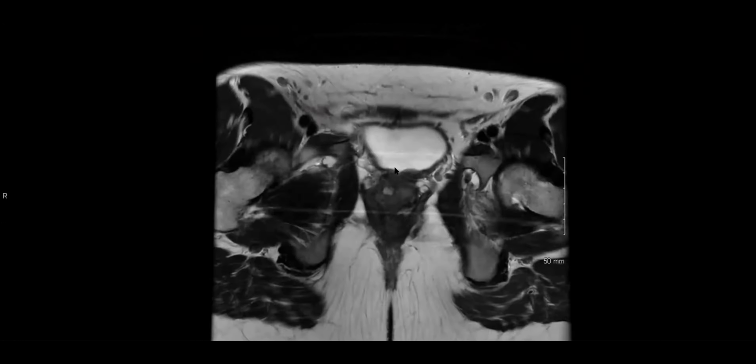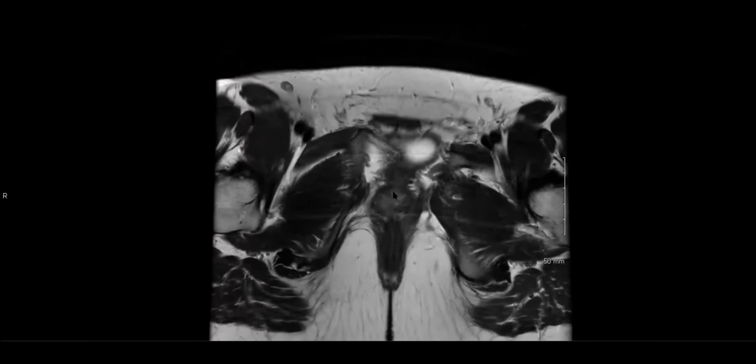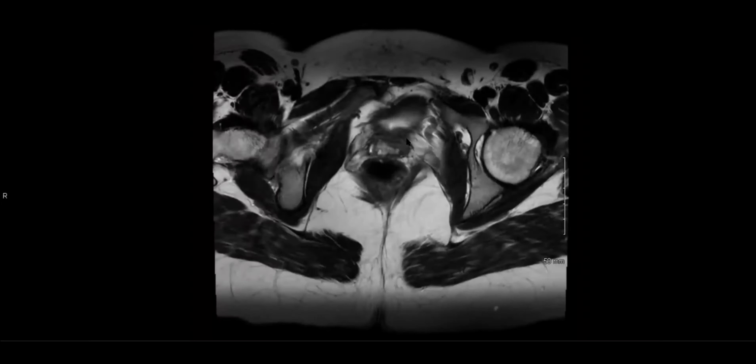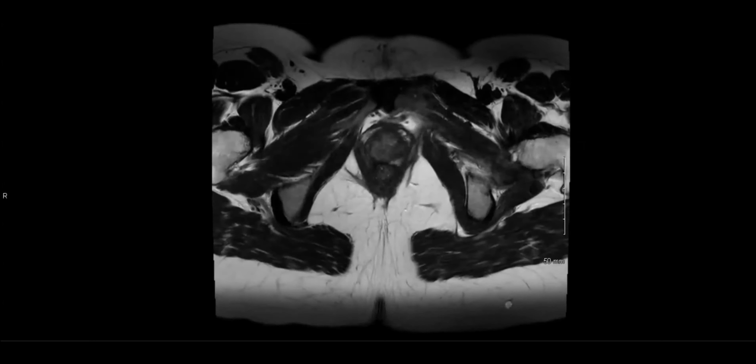So as we walk down, almost done with the case, they say, you know what, her urethra really looks funny right here. So you can see that this is really not a normal urethra. The urethra kind of lost its normal definition. Let's see, here's the non-oblique T2. You can see that we don't have that nice normal urethra where you see a rounded target-like appearance with a nice band of T2 hypointensity where the muscle is supposed to be. So something is happening to her urethra.